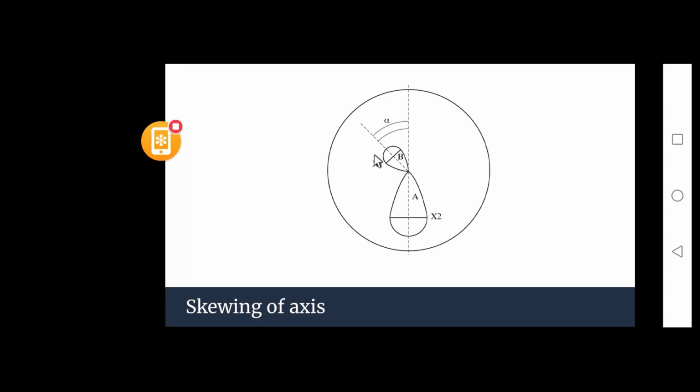Now at times this could be a regular pattern. This could be present in normal cases as well. But we need to be very sure that the angle between these two should not exceed 22 degrees in normal cases. It will never have more than 22 degrees in normal cases. So suppose you find that there is 22 degrees or more than 22 degrees, that means the patient is a suspect of some sort of an ectatic disorder. Right. So I hope everyone is clear. Please, if anyone has got a doubt, please ask, because this is something very important and you'll be applying it in your day-to-day life.